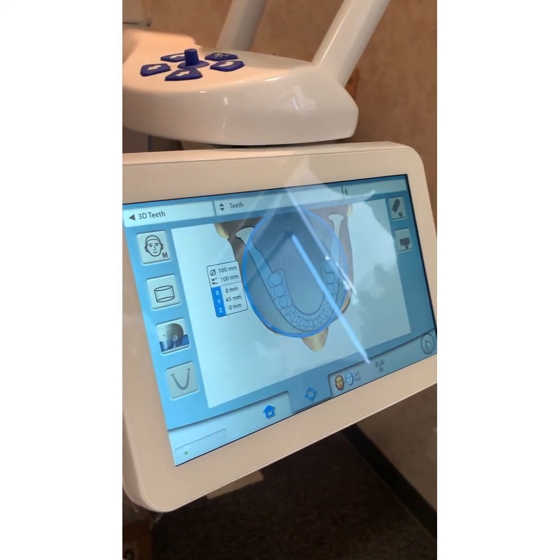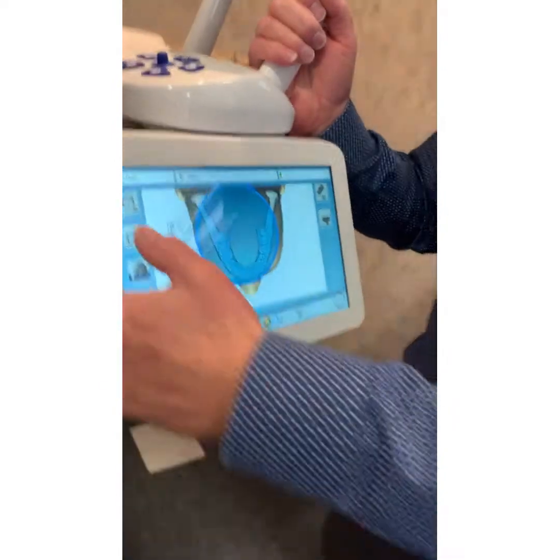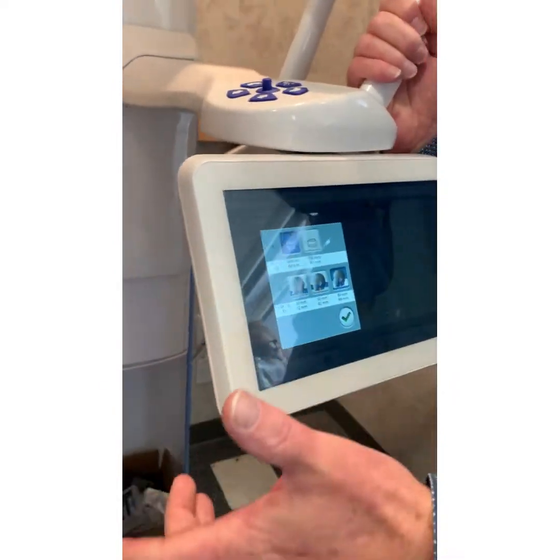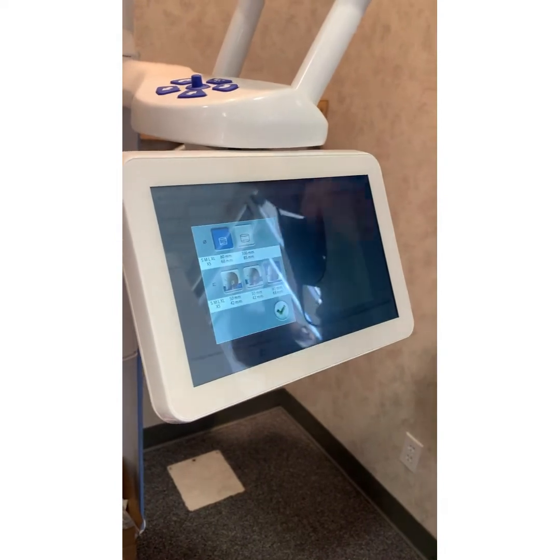So 10 by 10 is really your good implantology scheme. A 10 out of 10. Yes, 10 by 10. Now we'll go back to what you said about the arches here. Let's keep it at 8 by 8. Let's say I just want the mandible.